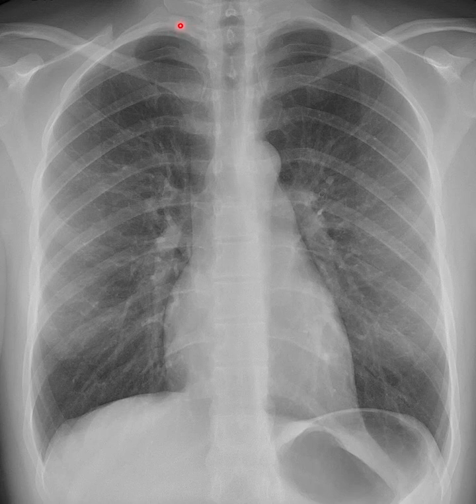So the very first rib is a short rib. It's right here. It looks like a little, I call it the curly Q, but it's just a very short rib here, okay? And it kind of helps us to identify the area of the apices, that most superior part of the lung. So that would be rib 1. Rib 2 crosses over rib 1 here. Rib 2, I'm following it all the way to the anterior part.